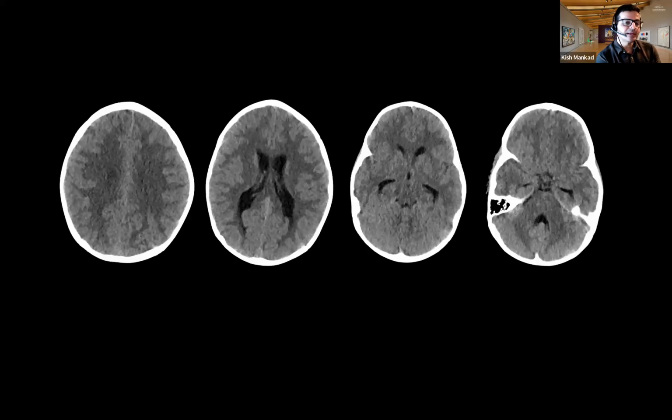Even then, there is no guarantee that you would get sagittal and coronal reformats. But in this case, I can tell you that the sagittal reformat would not have added any more at this point in time. So with only the axial view, we have to decide whether this is safe for lumbar puncture. A question before that really is, what are you expecting in the scan that will tell you it is unsafe to do lumbar puncture? Let's answer that question.